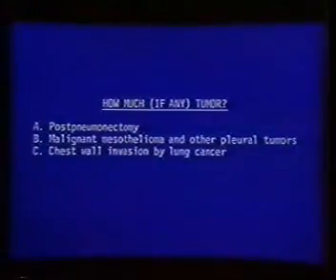Now, another situation we can look at is a variety of pleural tumors, in particular malignant mesothelioma, but also pleural metastatic disease and benign pleural neoplasms. CT generally shows malignant mesothelioma to be just what you'd expect it to be from your experience with plain radiographs. It's a diffuse multilobular soft tissue mass, but these are things that are almost always pretty well seen at conventional radiography as well.